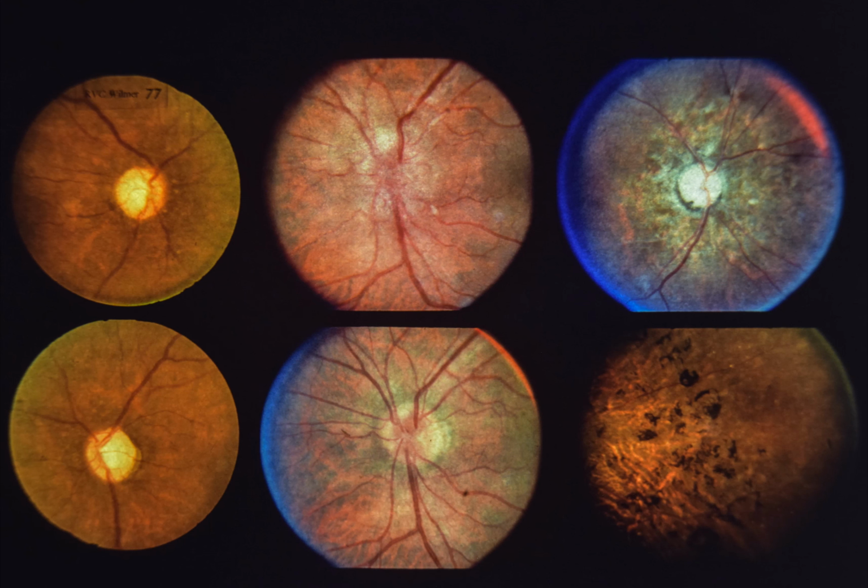This fundus picture has been called angiopathic retinitis and is characterized by marked optic atrophy and severe retinal scarring with pigmentary degeneration. Lower right. This asymptomatic 64-year-old male had visual acuity of 20/20 OU. His left eye was normal. The nasal fundus in the right eye has extensive pigmentary change, including pigment migration into the retina. There is a dense temporal field defect corresponding to the changes observed in the nasal fundus.